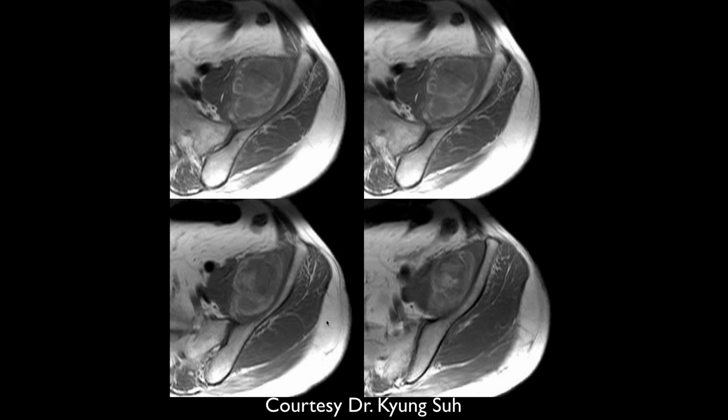Okay, now we're on to MR. These are axial images, and we see this lobular intermediate hypointense structure with a slightly intermediate hyperintense rim. This was somewhat abrupt. It's pushing on the iliopsoas out like that. It doesn't look like it's invading the adjacent soft tissues or the bone, really. There's a little bit of hypointense signal of the adjacent bone, but I think it's okay. The important thing here is you've got this hyperintense linear signal intensity and amorphous signal within it. And that's what makes this different from most other lesions.